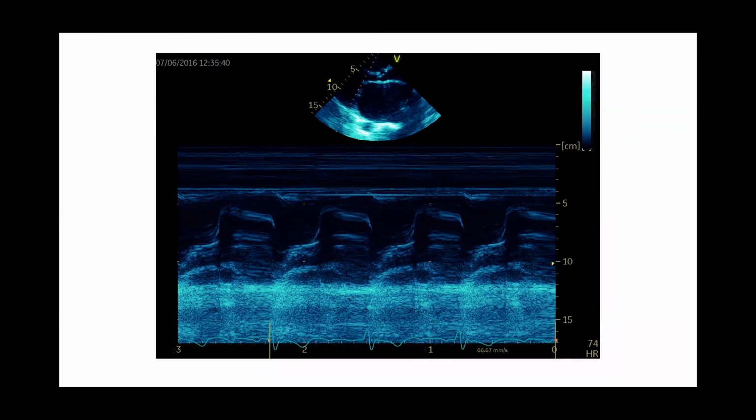Ooh, I just love M-Mode. So, Enna, yeah, I'm finding it hard to interpret those images, but there seems to be a gap even during anterior leaflet. Yes, yeah. This is your posterior. Yeah, so there seems to be a gap in between. Yeah, based on this, looks like it's moderate. Say it again, Vishal. So based on the M-Mode, looks like it's a moderate stenosis because still you can see a little bit of opening here. All right, yeah.